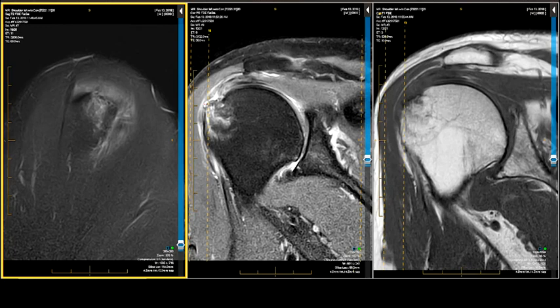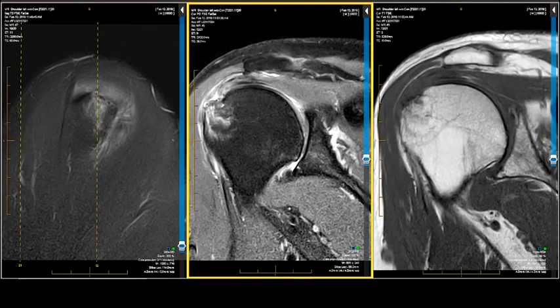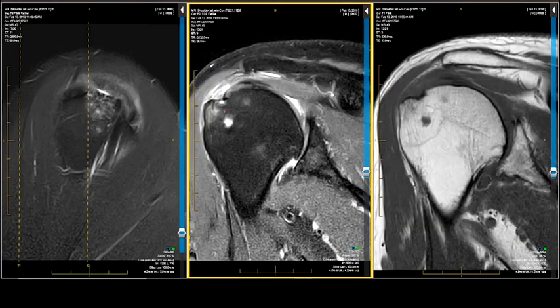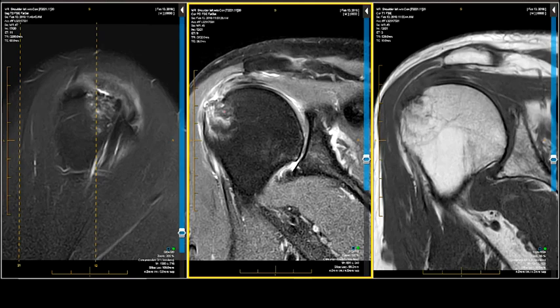This one's actively inflamed. This one is penetrating. A good get-out-of-jail-free card: near full thickness tear. Really, that works. You can say near full thickness or full thickness with surrounding tendon fibril failure, less than 1 centimeter in size, horizontally oriented at the footprint, inciting edema in the greater tuberosity with a rim rent component. Its medial lateral dimension you'd measure. Now it's about 9 millimeters. Its AP dimension or length about 7 to 9 millimeters. Are we there yet? No, we're not there yet.